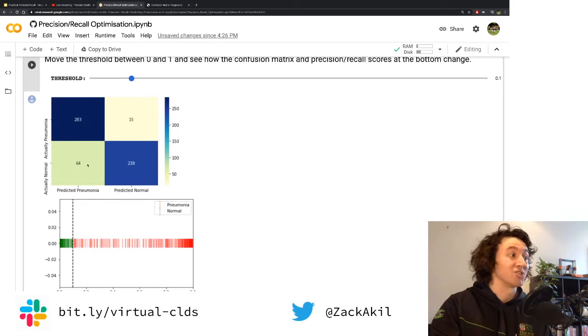283. Right, and you can see this went up. So the number of falsely predicted for pneumonia went up. See the trend. Okay, let's try to minimize this number. Let's say we do not want to accidentally predict people to have pneumonia. So what do we do with that?